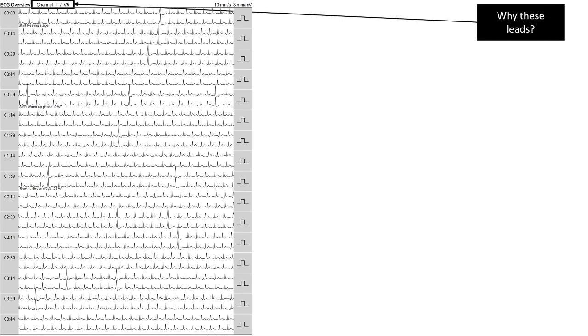And then what's quite interesting at the last one is here you can see a PVC occurring during the last 10 seconds of the last part of cooldown, phase 3 of cooldown. Then to determine if there are any rhythm disturbances, the system also gives us each and every ECG wave during the test. And what is very apparent when looking at this part is it's very easy to see if there are any rhythm disturbances, especially premature ventricular contractions.